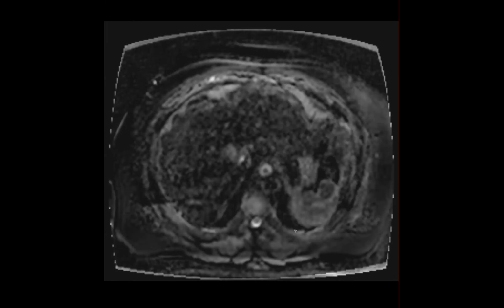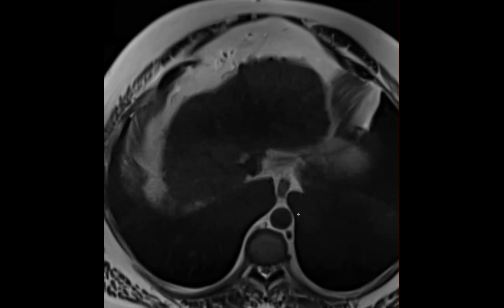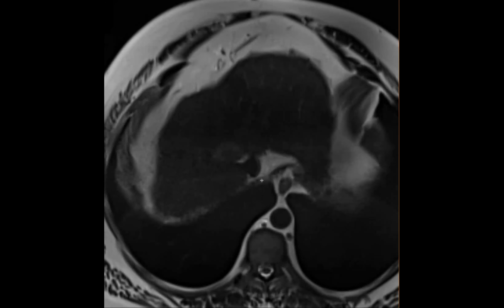That's like hypervascular and restricting. Yes. Wait, was that ADC shining through? And it looks kind of evil grayish there. Yes, it is evil gray. Yeah, I don't like it. And does the liver look cirrhotic?